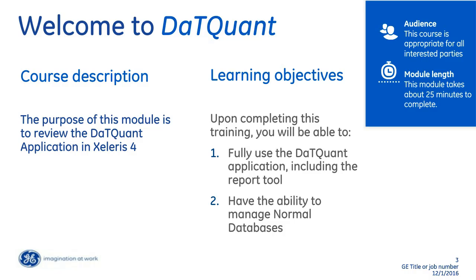So what is DaTQuant? DaTQuant is an application that provides a platform for the reconstruction of DAT scans and a means of quantifying and comparing DAT scans to a normal population. So we'll proceed to look at the application, and I'll just set that up.